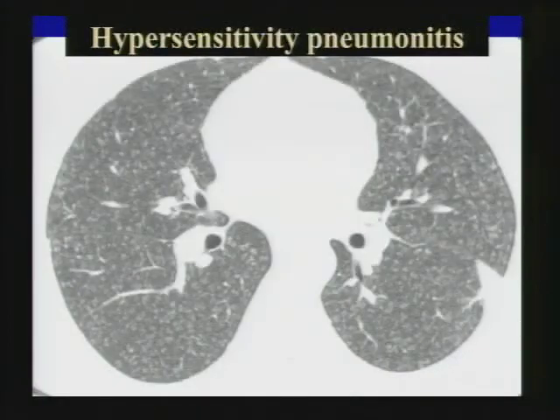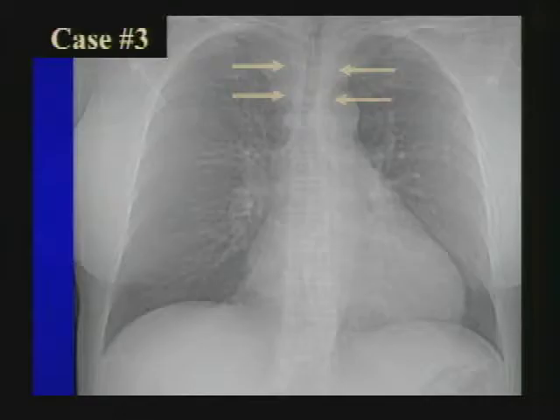So this is a beautiful example of hypersensitivity pneumonitis, okay? Could be, if it was a smoker, respiratory bronchiolitis. If the patient just had acute symptoms, viral bronchiolitis. Beautiful example of tracheal wall thickening. You see tracheal wall thickening.